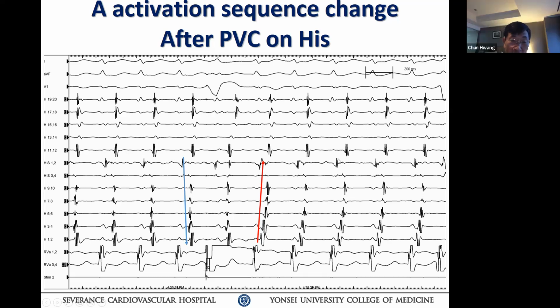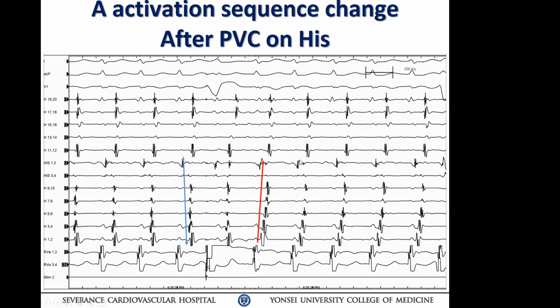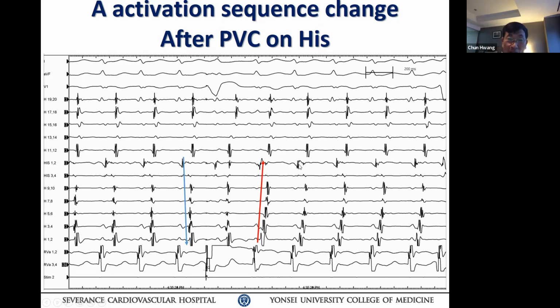What I'm trying to tell you is, which pathway is dominant here? You need to answer that to me first. Septal or the left lateral? It's septal. So that's why your tachycardia EKG looks the same in the first and second tachycardia you showed me, because there was no change. So when you look at the tracings, you need to measure this interval carefully. There was one transient dissociation of the septal tachycardia, which went to the left side, then came back around.